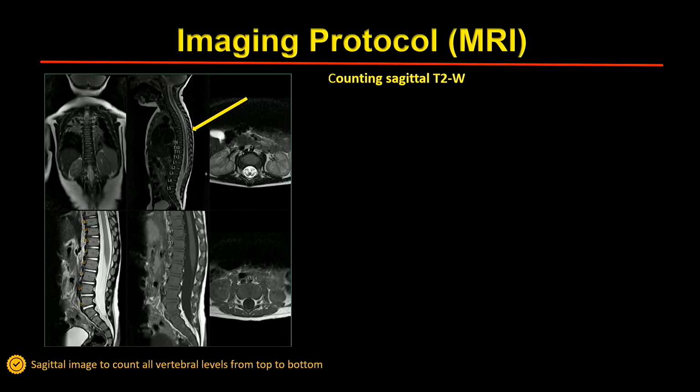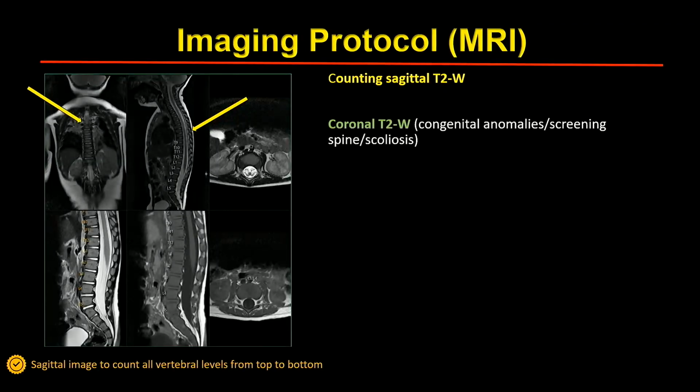We also, in our spine MR protocol, include a large field of view coronal image, which is extremely helpful in my experience. It shows the transitional vertebrae with more accuracy. It shows the segmentation and fusion anomalies. Most of these patients have scoliosis, and it can show you the curve. It can show you the paraspinous soft tissues much more beautifully. It can distinguish a hypoplastic rib from an elongated transverse process. So these two large field of view images are our workhorse, whether we are doing total spine imaging, lumbar spine imaging, or thoracic spine imaging.